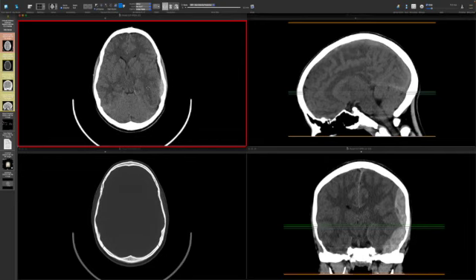And then there's midline shift. Just a quick pro tip on measuring midline shift. We're going to use our measurement tool here. We're going to find the falx where it attaches to the anterior portion of the skull and the posterior portion of the skull. We're going to make a line, and we're going to make sure we're at the level of the foramina of Monroe, where the lateral ventricles and the third ventricle meet. We're going to take our measurement, and that's how we can get a nice, consistent midline shift measurement on every case. So there's actually 7 millimeters of left to right midline shift, or as we also call it, subfalcine herniation.